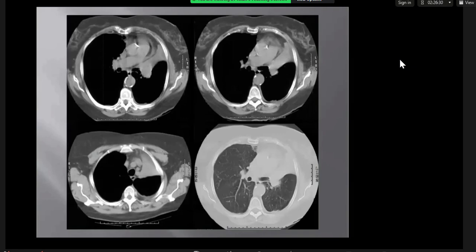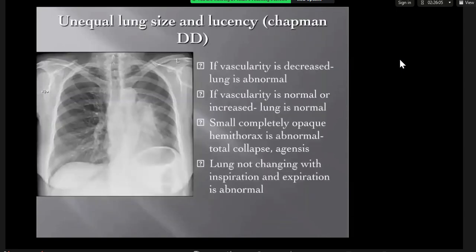These are selected axial images of the chest, presumably the same patient. We can see that there is dense collapse of the left upper lobe with possibly some mediastinal shift towards the left also, and maybe a trace pleural effusion. These findings would again be in keeping with the left upper lobe collapse. It appears to be due to a mass in the left hilum.